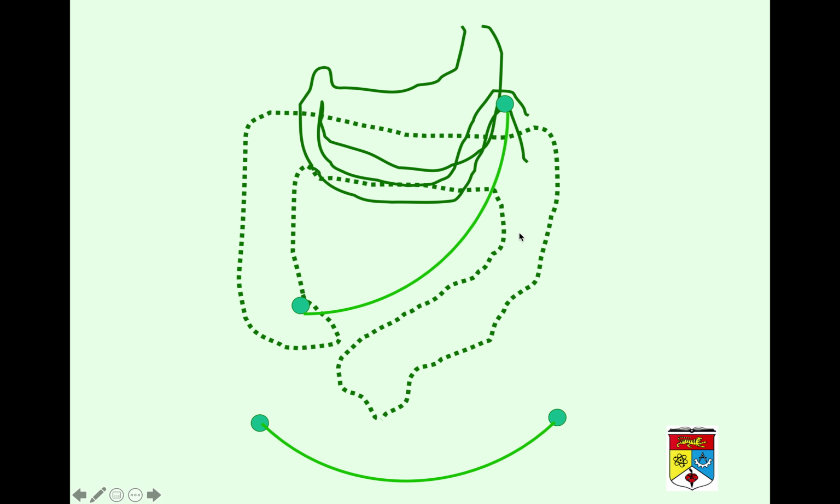Okay, so when normal rotation happens around the SMA, remember the DJ flexure that I showed you in the contrast meal earlier? That is where we know the axis of the SMA should be. It should run from there towards the ileocecal valve, and if you draw it, it looks like a smiling face. Okay, not a face, a smiling mouth.